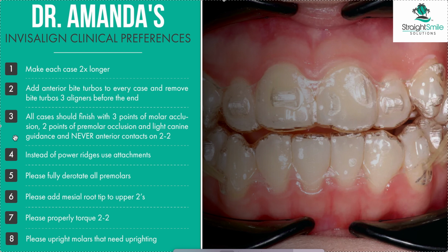Oh, another tip that you should always look for, that I always look for, is they don't always level your incisal edges. So click the lower button at the top, swing the lower jaw forward, and just look at your lower incisor edges. Sure, you can take a disc and smooth it off later if it's not that much, but why not just have the aligner do it right to begin with if possible? And you have to keep in mind, if something is worn off at an angle, well, you can't necessarily zing that off, unless it's super minor. You're probably going to have to intrude it and add some composite afterwards.